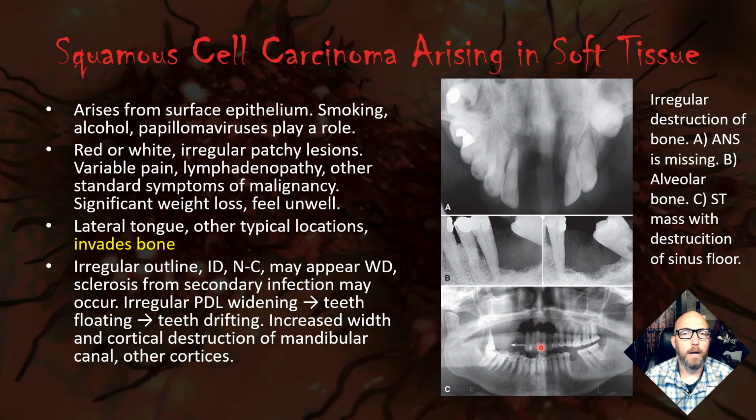Hopefully you've watched my lecture on interpreting panoramic radiographs, and you recognize all these different anatomical structures, especially the sinus floor and the zygomatic process of the maxilla. And you notice that one of those is missing here. There's no sinus floor. The maxillary bone over here is completely missing. You don't really see where it starts or stops. We've got this tooth floating in air here.